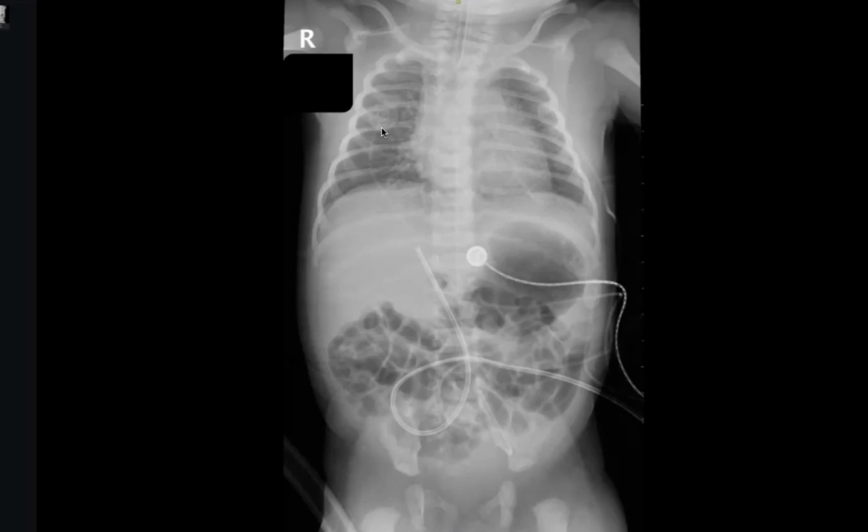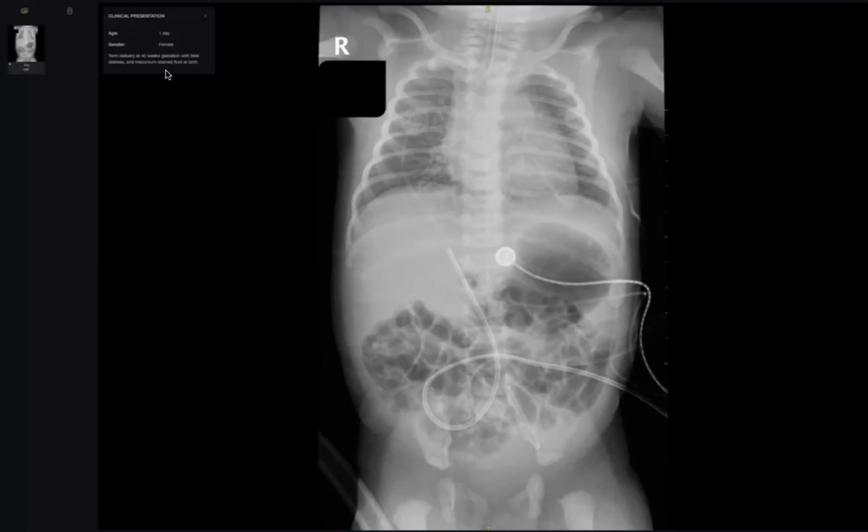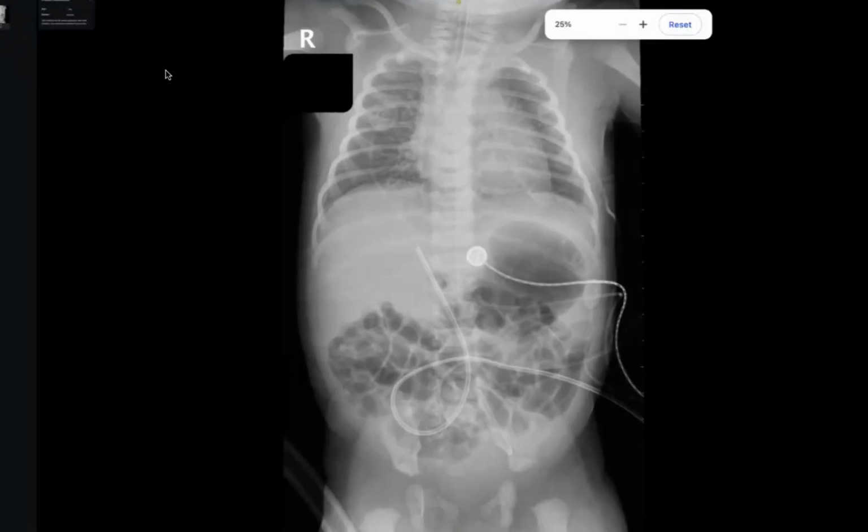From the history, I told you the patient is term. Delivered at 40 weeks, not 14. Okay, so some granular opacities are seen in the perihilar location, as the patient is term. Is this reticulation or granulation symmetrical, right like left?